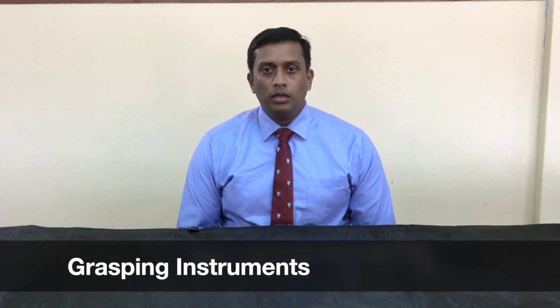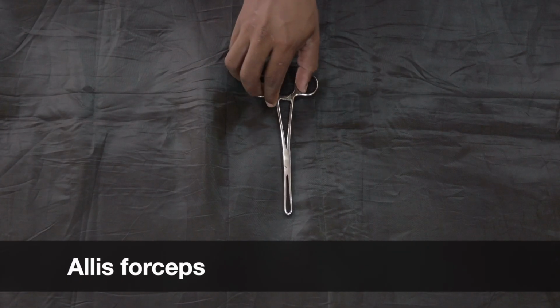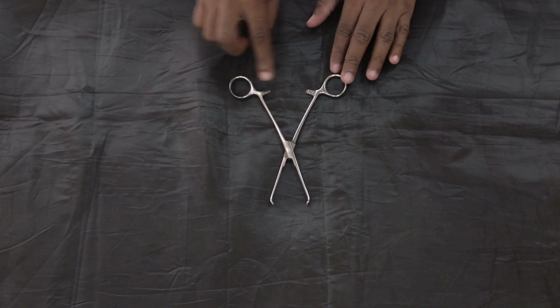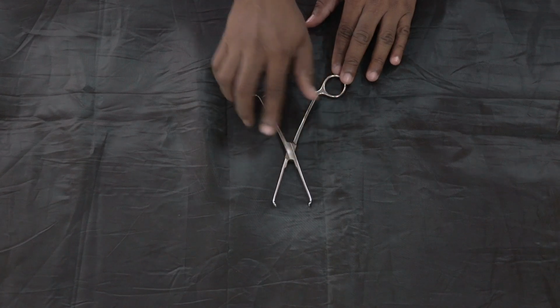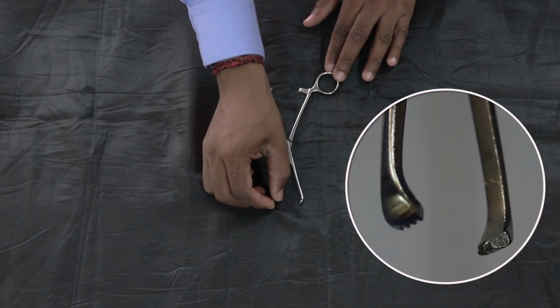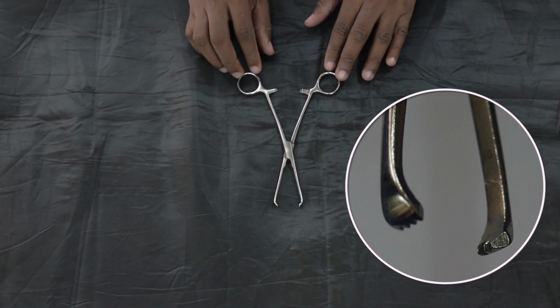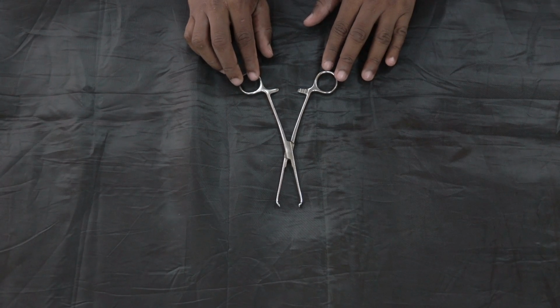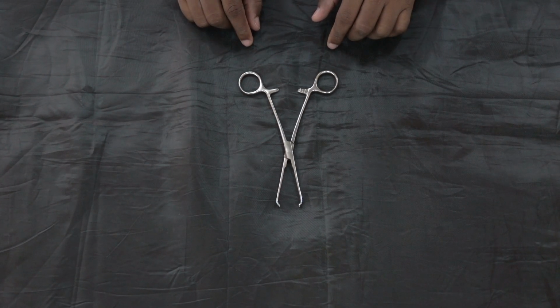We will move to grasping instruments. These grasping instruments are used to grasp tissues during the surgery. First is Allis forceps, which has a handle with lock and a straight shaft and the jaw, and at the tip it has a fine tooth which helps to grasp the tissues with minimal damage. Usually this instrument is used to hold the bladder during the bladder dissection.